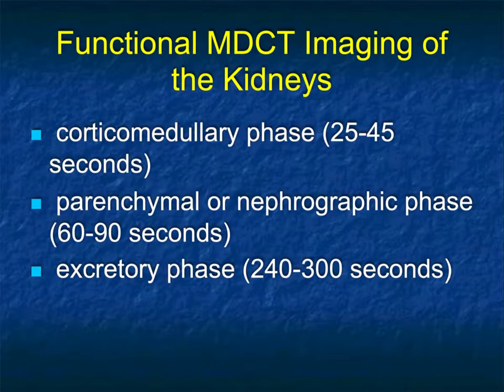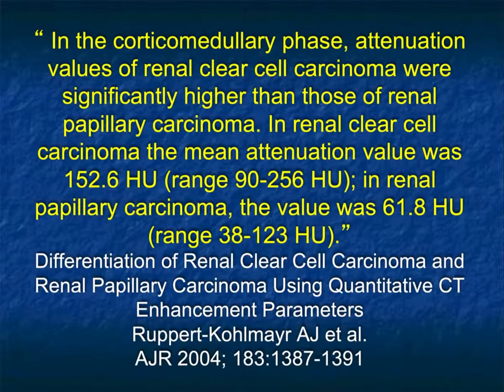Depending on the age of the patient, you don't necessarily need to scan all the way through the abdomen and pelvis. With the patient's parenchymal phase, you surely just need the kidneys. We do say on the early phase, corticomedullary or excretory phase, it really needs to be diaphragm down to symphysis. Again, very important.